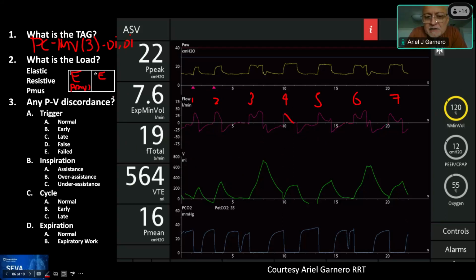There are some PMUS on some of them, and there is another, I would say, not voluntary PMUS after, but there is some sort of... it seems to be PMUS, or inspiratory effort during expiration also. Yeah, there's some PMUS over here. There's some PMUS that's evident here, maybe here. So some expiratory PMUS, like there's some PMUS noted in expiration, and we'll talk about whether that's expiratory work or not.